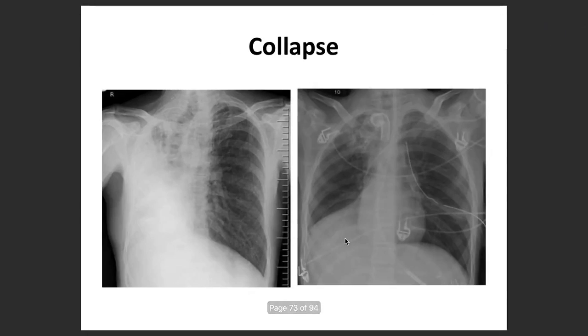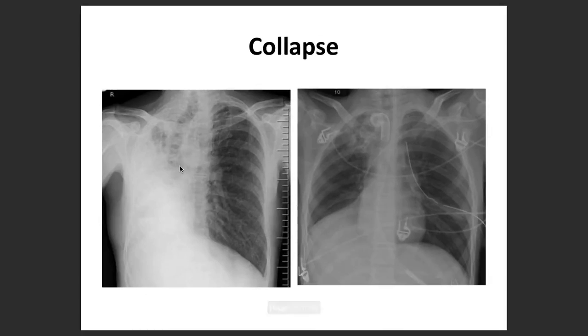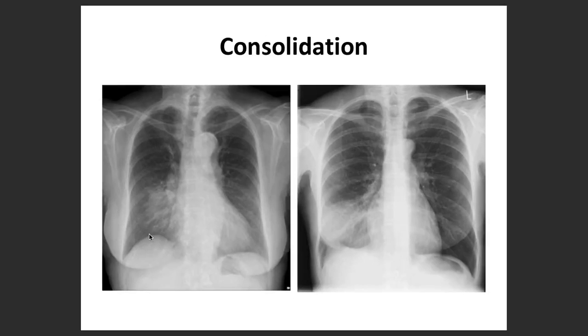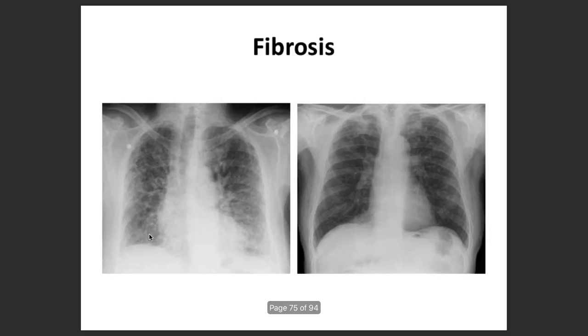Wonderful. So you are all now the expert masters in this as well. These are the different examples, if you will see. This is for the right upper lobe. Collapse, yes, exactly, and or atelectasis as well. Over here, almost the middle and the lower right side is all gone, so you can literally pinpoint as well. That's why it's really important to have a look. So what about fibrosis? What are the changes you notice in fibrosis of lung?